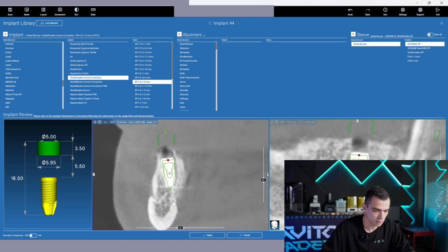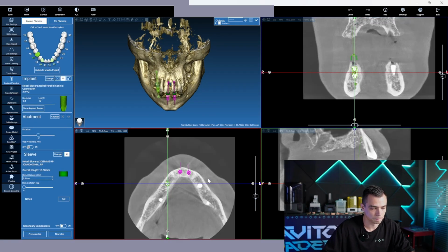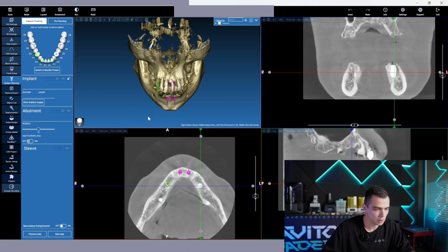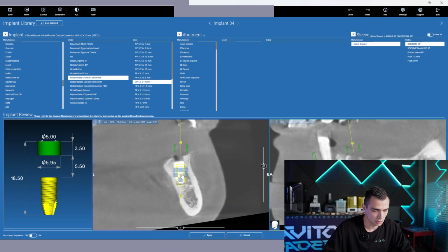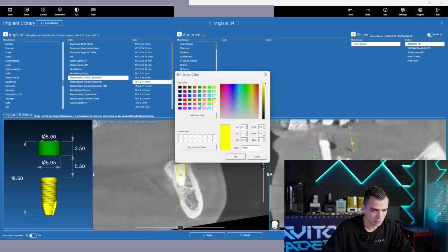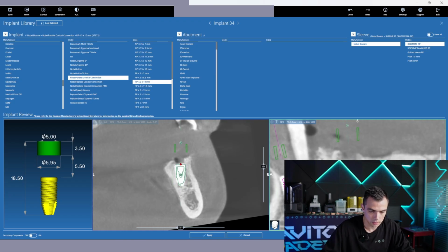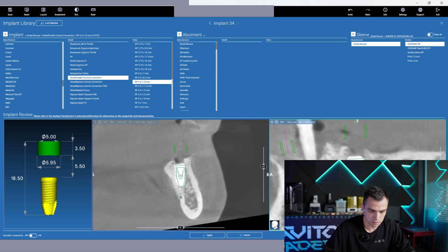And yeah, the most challenging part is to set up the needed incline. And so, okay, we're almost done.